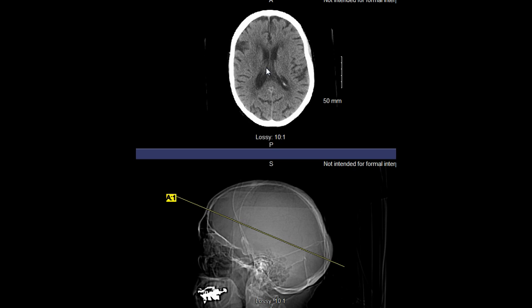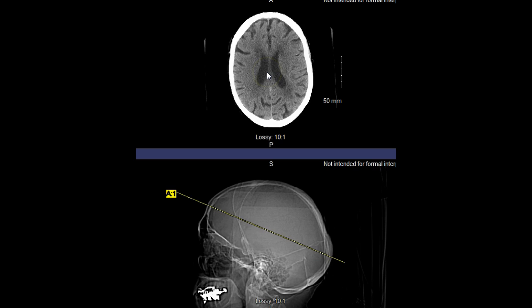So looking at the lateral ventricles, we'll start off with the horns. So you can see that here's the frontal horn on both sides respectively, whereas here is the posterior horn respectively there and there. Additionally, you can see the structure of the choroid plexus here. You can see a little bit of calcification that's associated with that structure. So that visualization, though, is pretty clear.